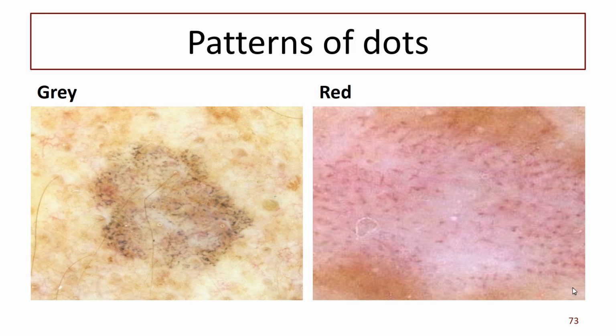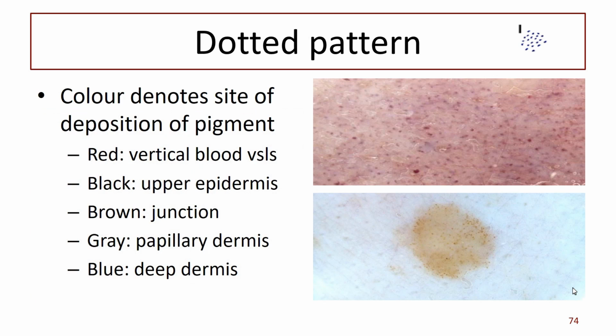And does the fact that it's a dot tell us anything more about the blood vessel? The way they've been cut, maybe? Emily? The direction, exactly. So a capillary going vertically, we see as a dot, whereas a capillary going horizontally, we see as a red line. If it's a venule, it's going to be what colour? Blue. Okay? So we can see red dots from capillaries and red and blue lines.